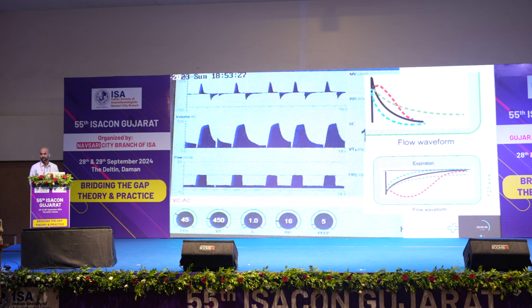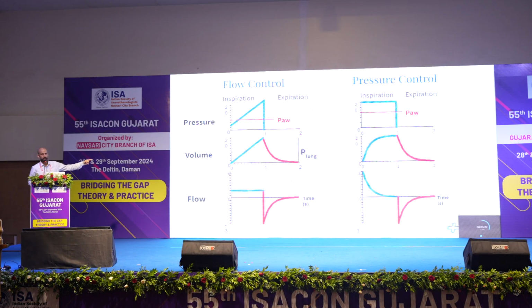This is a Draeger ventilator. Draeger is notorious to do this. Keep a sharp set of eyes on the waveforms. This is pressure control, and this is what the pressure control waveform looks like. So just a memory jog for you guys post lunch: square shape for pressure control.